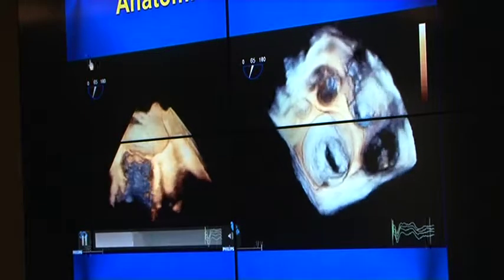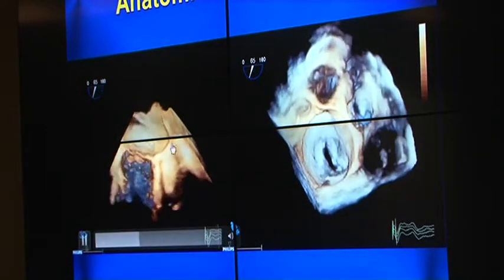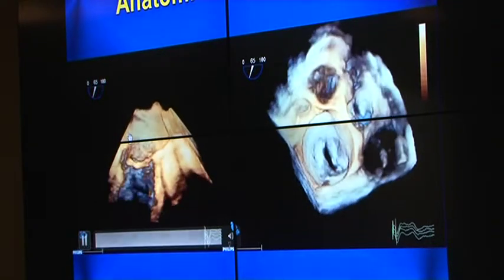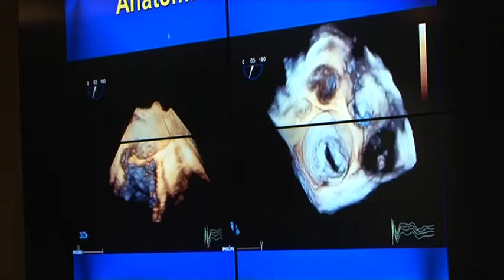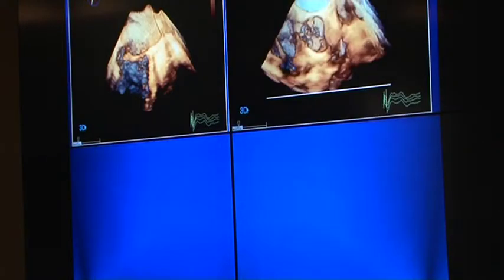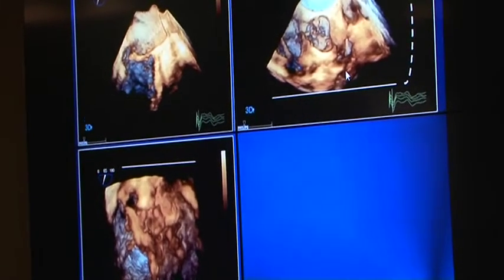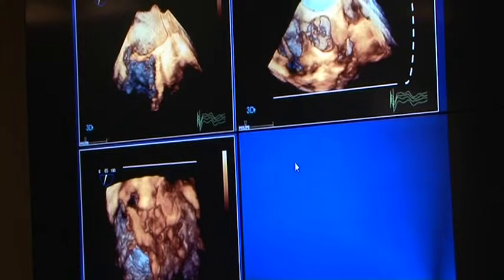So this is, what is that? You can see this is acquired at 60 degrees, a bicommissural view. You can see the half-crop full volume data set. And how to produce anatomical orientation, I will show you in a few slides. So acquire this one, and then reset cropping, display the entire volume. If you are ready with that, you will have to grab this bottom line and rotate it upward, so to change the direction by 180 degrees.